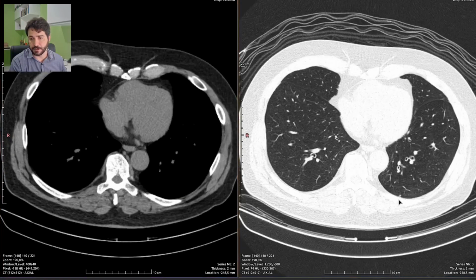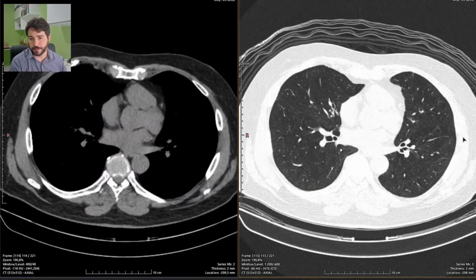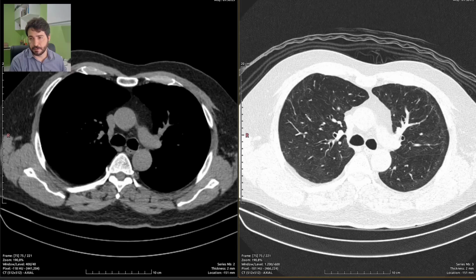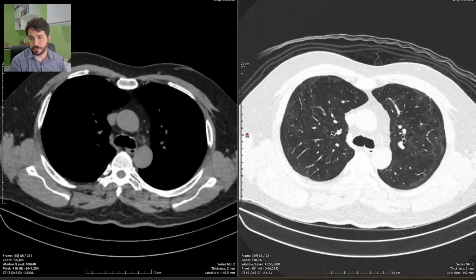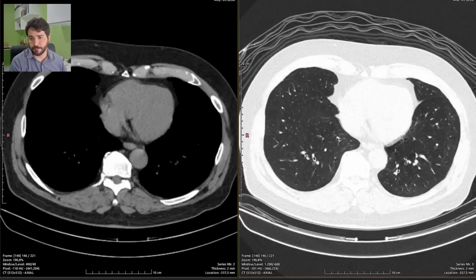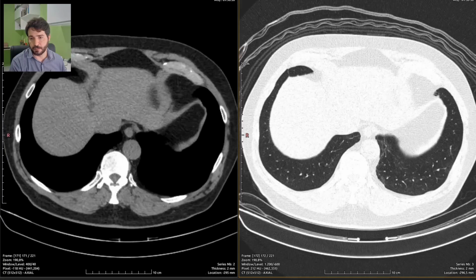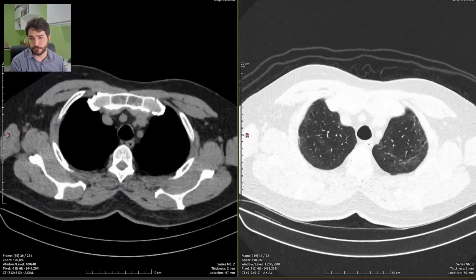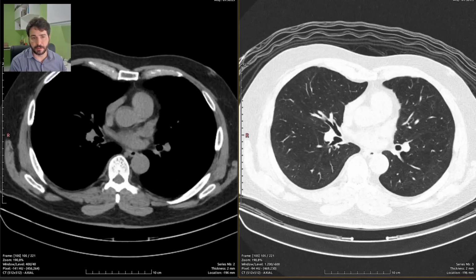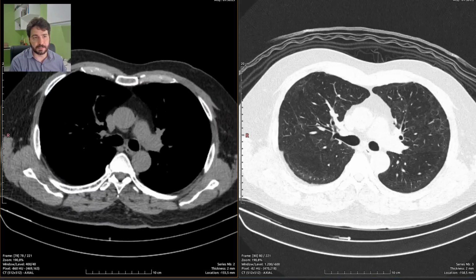There is a tiny calcification right here. It is a tiny scar, calcified scar. This is of no significance. So linear atelectasis on cortical regions, mostly on the upper lobes. Some signs of anomalous content, anomalous filling of airways, especially on the lower lobes. Some atherosclerotic disease of the aorta and the coronary. He also has left-sided gynecomastia.